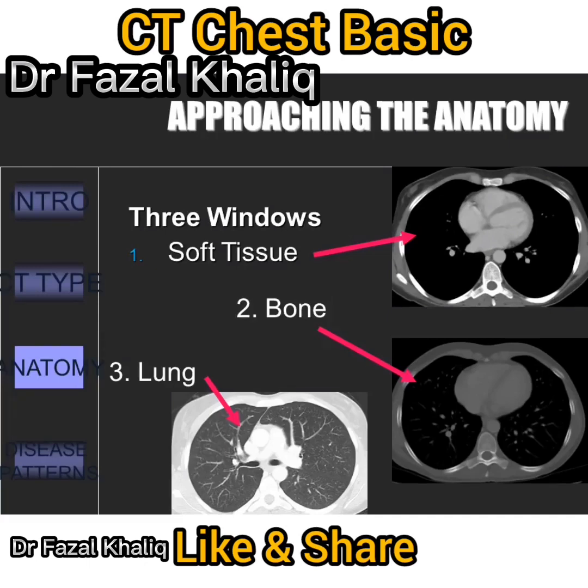When looking at chest CTs, I would suggest switching from windows in this order, or else you might get bogged down by the lung parenchyma and forget about the bones and the soft tissues. Remember, the key is to be systematic.